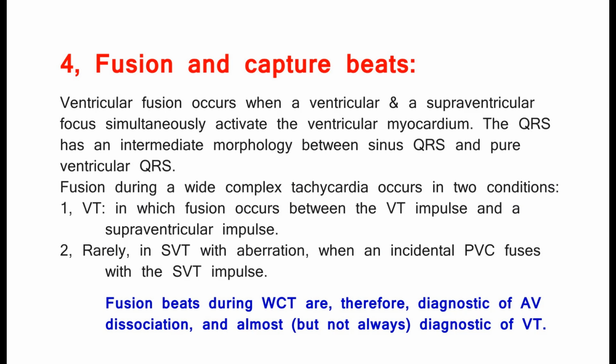1. VT, in which fusion occurs between the VT impulse and a supraventricular impulse. 2. Rarely, in SVT with aberration, when an incidental PVC fuses with the SVT impulse. Fusion beats during WCT are, therefore, diagnostic of AV dissociation, and almost, but not always, diagnostic of VT.